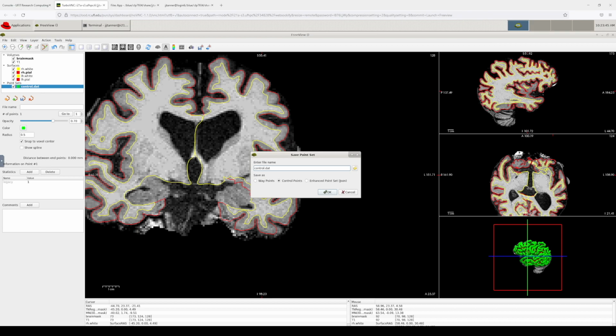This brain really doesn't need any of it. I checked earlier, and there's a couple of parts we could fix, but not enough to worry about. But some brains, there was one I'd done a case report on for a study that had been missing a lot of the temporal lobe. Okay, so that was saved.